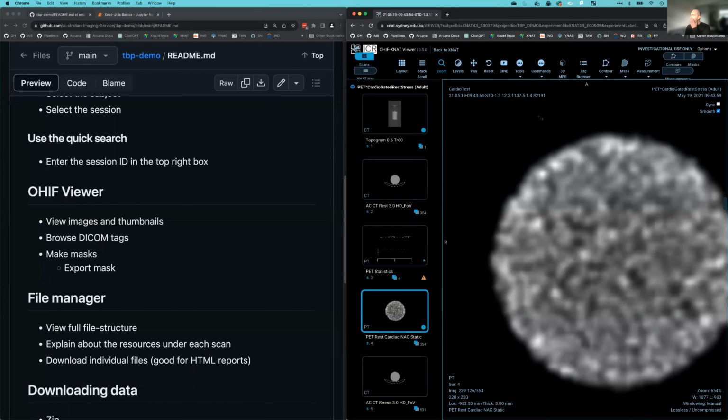You can also do some neat things, like there are these masking tools that you can use. It's quite a nice one here, this magic auto one, where you first click, and it will pick all the contrasts that are available within that circle, and then only highlight regions with matching contrast.